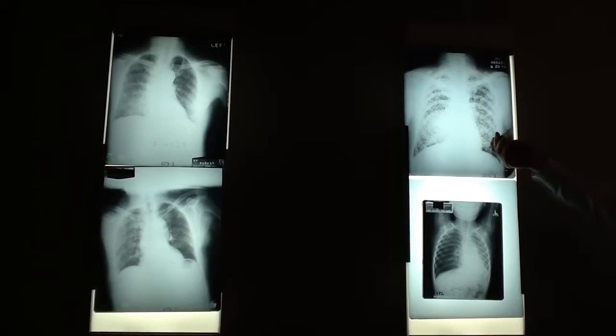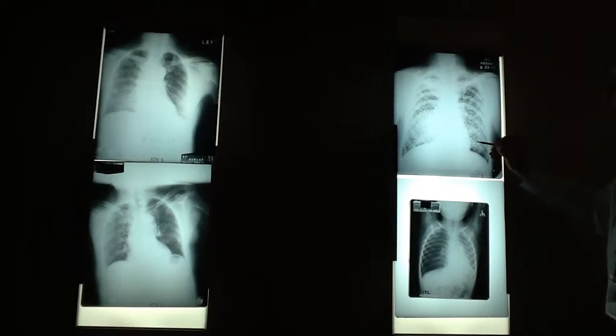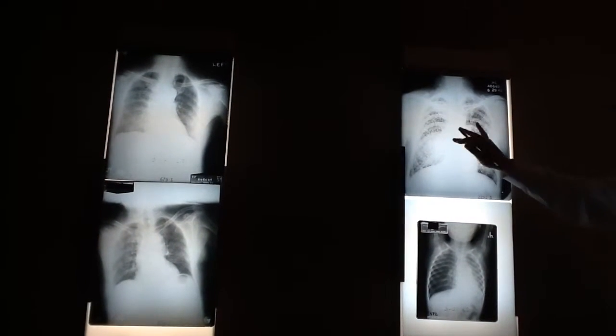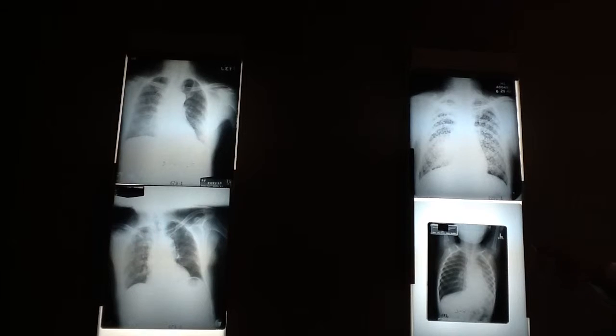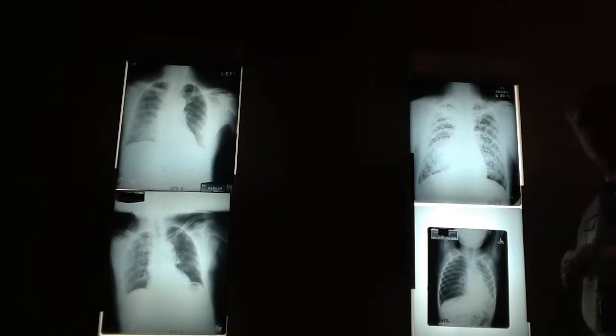This is nodular. You see how much more dense this is? And they're larger, aren't they? I mean, they just look bigger. This is the 5 to 8. And there's not much difference between 3 to 5 and 5 to 8. The difference is density, though. Because 5 to 8 gives a lot more density.